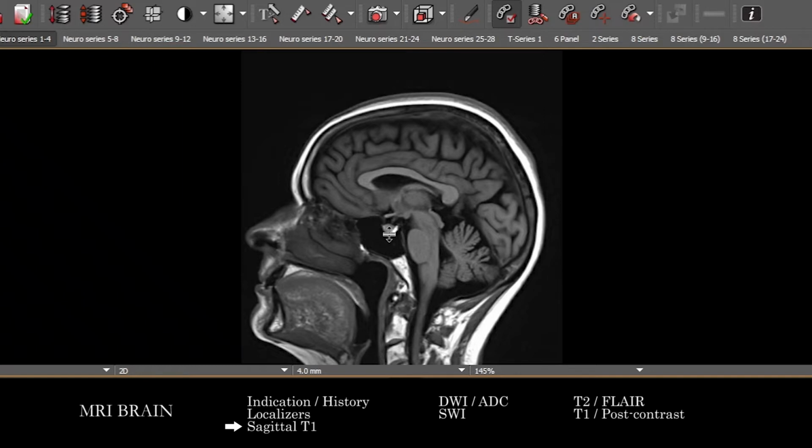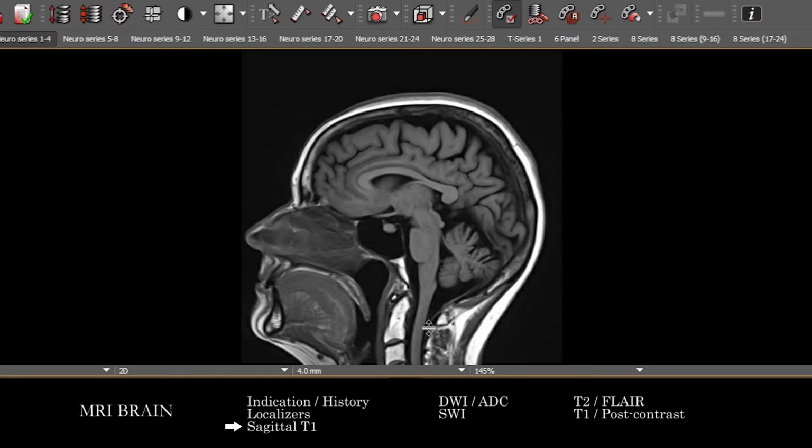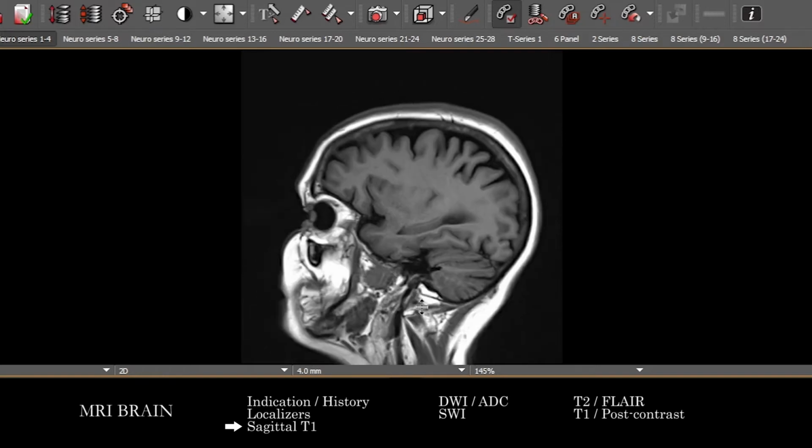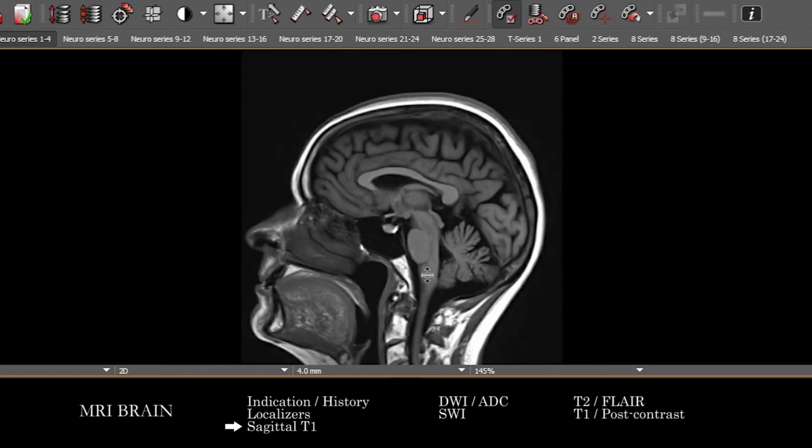We're looking for mass lesions, cystic structures, any sort of mass effect in these areas, and then particularly here low-lying cerebellar tonsils, any sort of herniation or other abnormalities of the skull base, and also making sure we don't miss any sort of abnormalities of the incidentally imaged upper cervical spine. Okay, and then we're going to come back to that area, particularly on the post-contrast T1s.